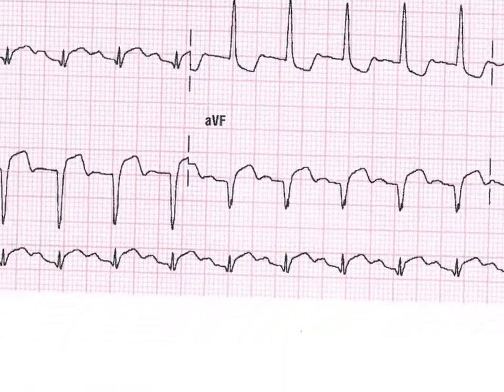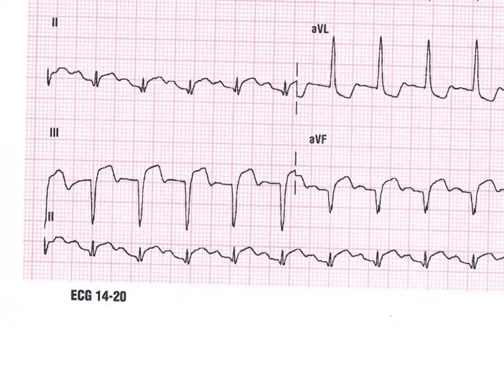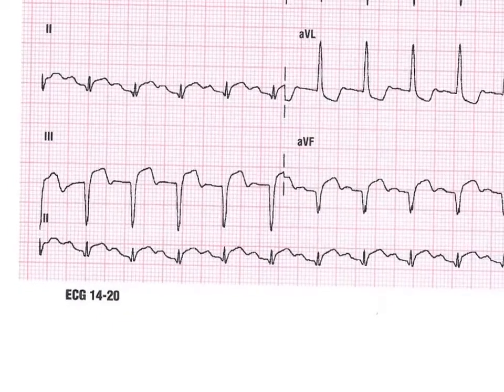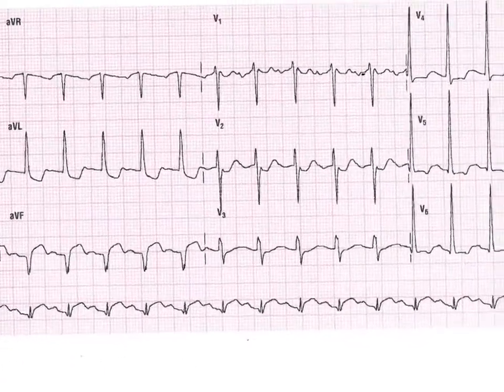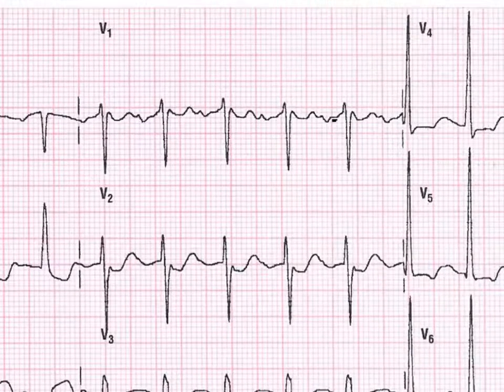It's very regular, and there are P waves for every QRS. And if we look down here in this rhythm strip, the lead 2 rhythm strip, it looks like we have some very strange things going on with a very marked lengthening of the PR interval, but because that one's weird, I'm going to look up in V1. That's the very best place to see P waves, and then I'm going to mark on this as best I can. Just slow down here a little bit.